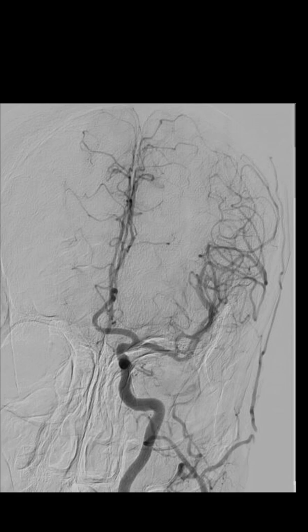This is the intracranial view. Try to identify the vessel. This is the internal carotid artery. This is the petrous segment. Always remember the petrous segment is very important for the interventionalist. You can park your catheter here if you are doing an intracranial procedure, which is the stablest part.